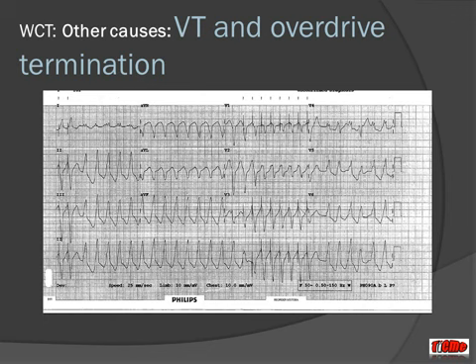Here's another example of a broad complex rhythm. We were quite lucky to get this as a 12-lead ECG. Some people who have pacing defibrillators have obviously got different modes which terminate their arrhythmia. Usually pacemaker defibrillators don't deliver a shock for VT initially. They'll try to overdrive. So here's a beautiful little ECG example of someone initiating VT, then having overdrive by the pacemaker, going back into what we hope is not VT. It's probably a sinus rhythm with bigeminy. So VT, pacemaker overdrive, sinus with bigeminy.